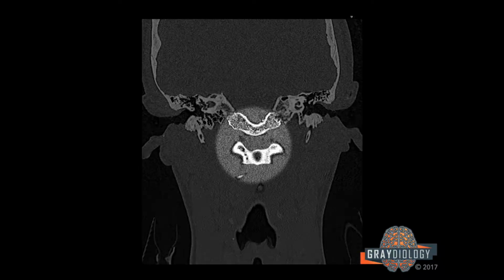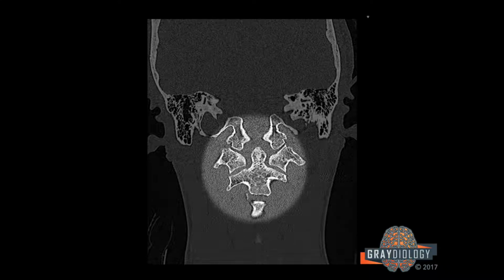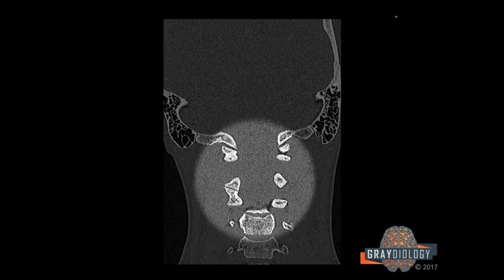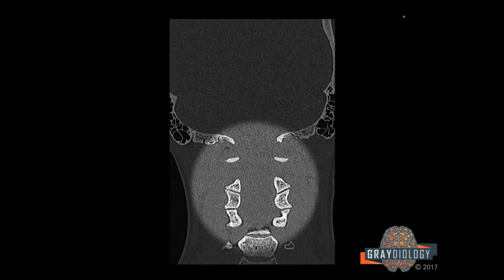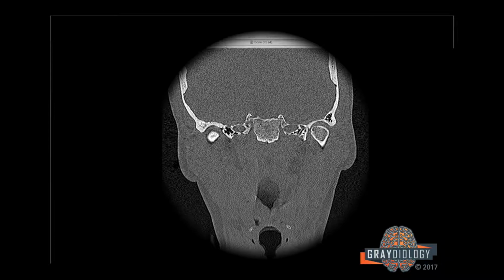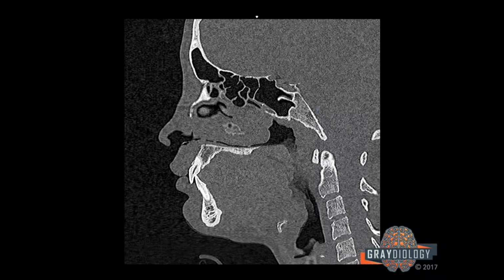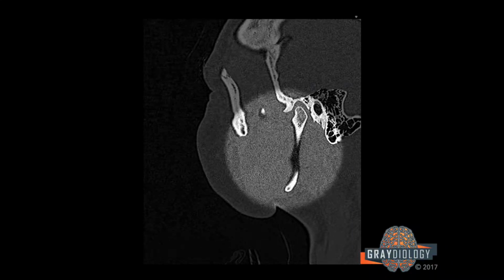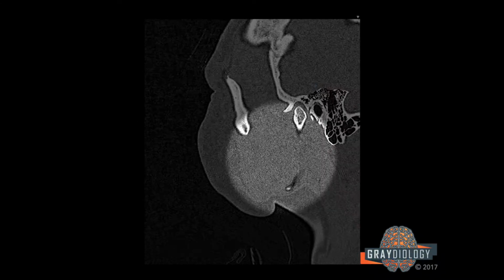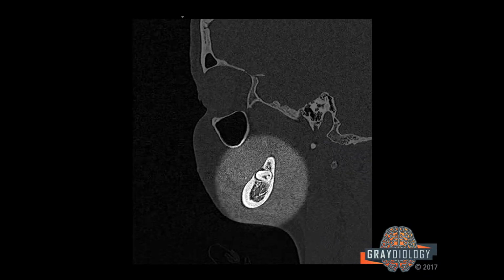The other things that I love to look at are the occipital condyles, because occipital condyle fractures can be difficult to see on the axial imaging. And of course, the craniocervical and atlantoaxial relationship is incredibly important. I'll look at the sagittal, again, to answer any questions that I might have come up with, but most often it is helpful when assessing the mandible. So I'll pay particular attention to the condyle, the coronoid process, and the ramus on both sides.